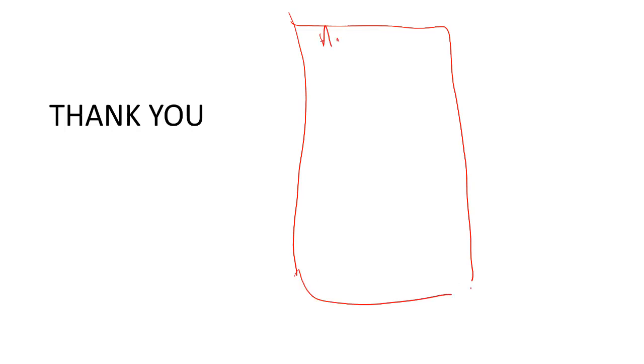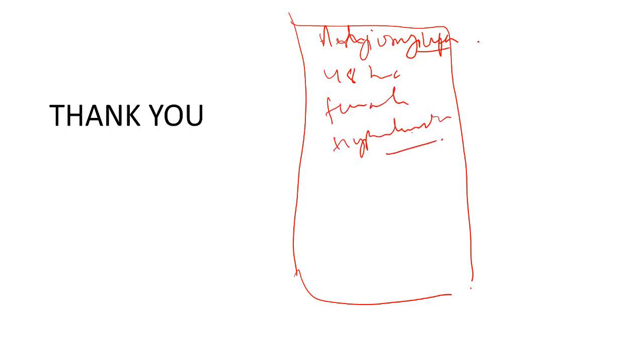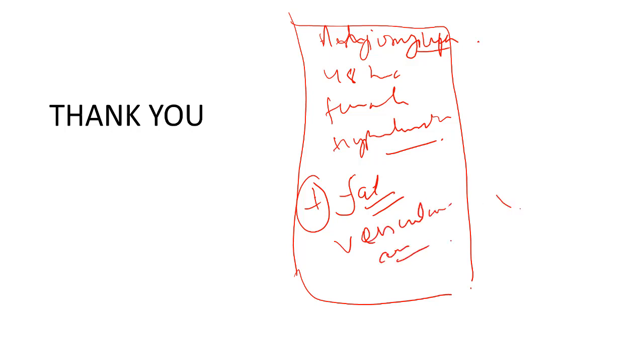Angiomyolipoma. So thank you. Till now we get to know that our mass is more toward angiomyolipoma, because a 48-year-old female was there. She was hypertensive, plus the fat component is very well seen on USG, some vascular component as well, no central stellate scar, no irregular margins, no calcification, no ossification, not a child, not arising from the adrenal as well. So finally, a differential diagnosis favoring our most probable diagnosis, that is renal angiomyolipoma.